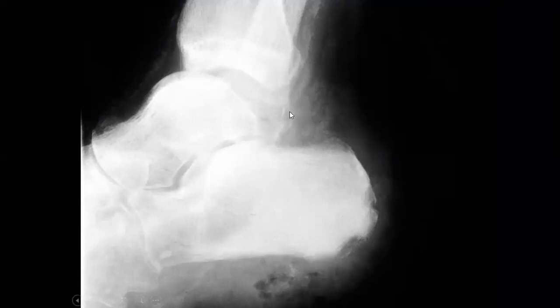Okay, so let's go to this case, which they like much in the exam. It can come as a long case, which is a bit difficult. So when you see this appearance, you will go either neuropathic or what? What in the history will you ask about? If this patient has what?